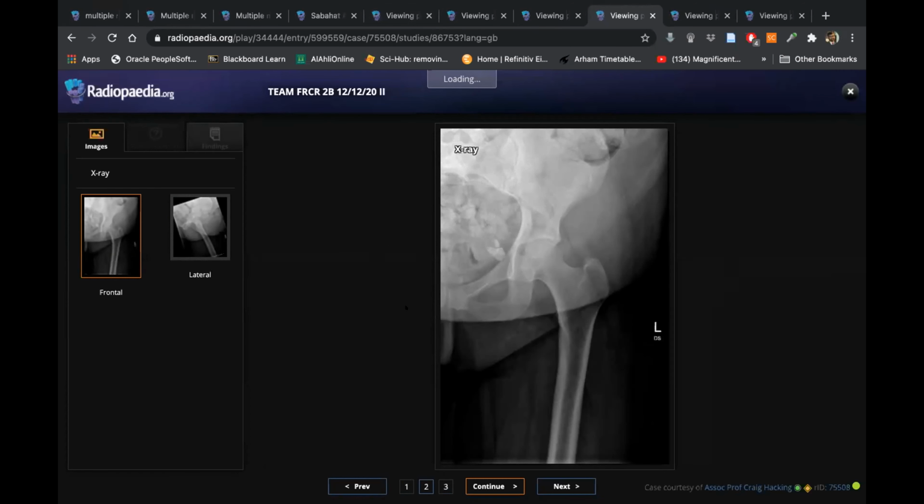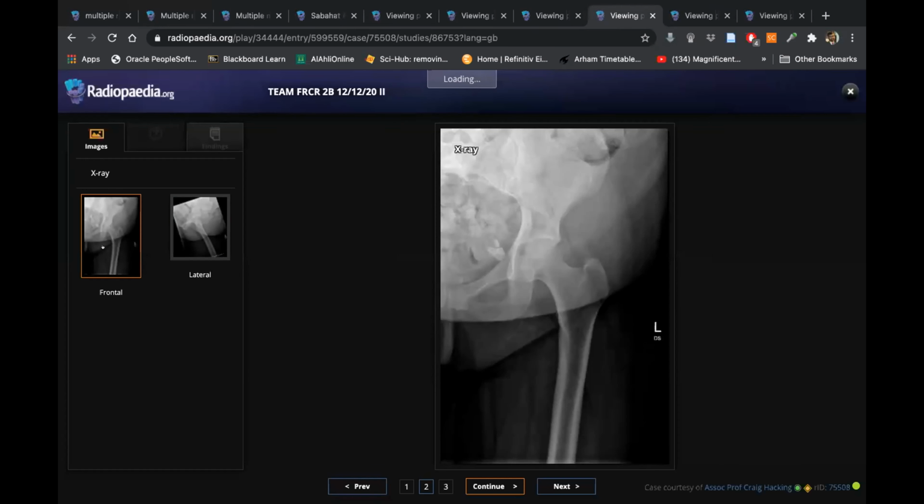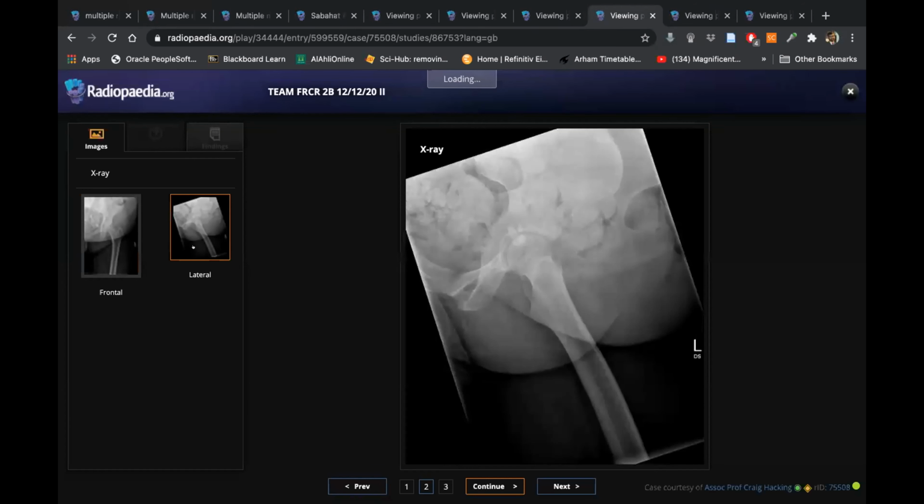The hip joint alignment is normal and the bone density is normal. There is slightly decreased superior joint space. I cannot appreciate any definite lesion, and the soft tissue appears to be grossly normal, other than these calcifications near the medial hip. On the lateral view, these are projecting.